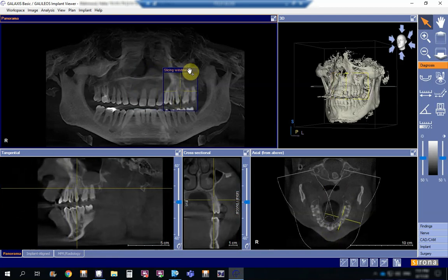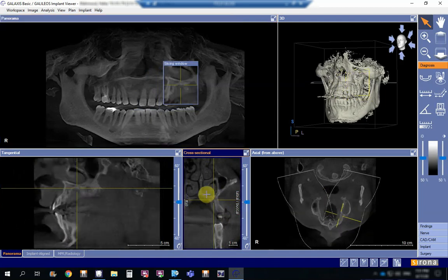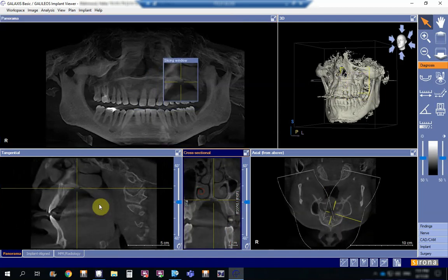And then I will go back again to the other side. The other side is also we start from the most medial. I'll take you to the medial side. See, this is the inferior concha and the roof of the palate, or the palatal shelf, and inferior incisive canal. Same thing, but it is from the left side. Tongue, dorsum, and this is the palate over here.